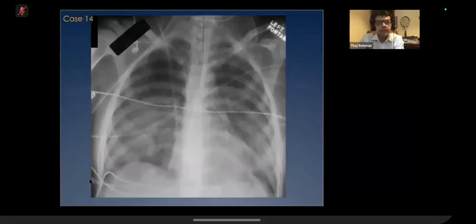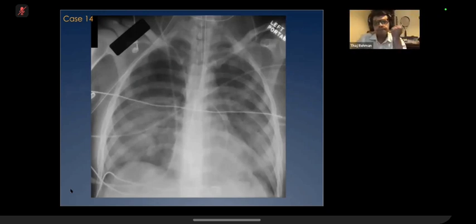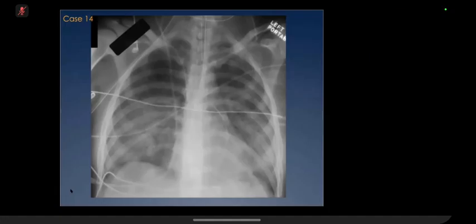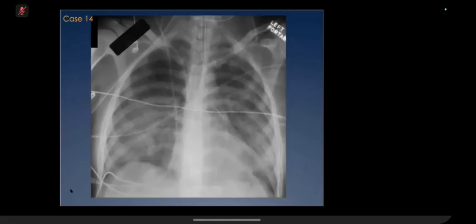Do you want to do this X-ray now? Next. Yeah, frontal chest radiograph. The patient has got an endotracheal tube with the correct position. There are ECG lines up, but the main abnormality is bilateral airspace opacification in both mid and lower zones. Yeah. You can say they are consolidations because you can see air bronchograms within them, no? Yeah. So it's patchy consolidation bilaterally, or in fact rather diffuse, I would rather say, in both the mid and lower zones.